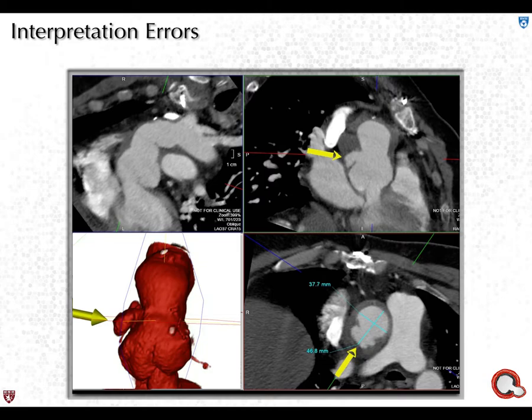They said this is probably a PAU. Well, this is a pseudoaneurysm, so his sutures had come apart. This is a missed pseudoaneurysm. So fortunately, Mark had me look at the report. I said, we'll send the images. He sent the images over, and we were able to get him back and fix it.